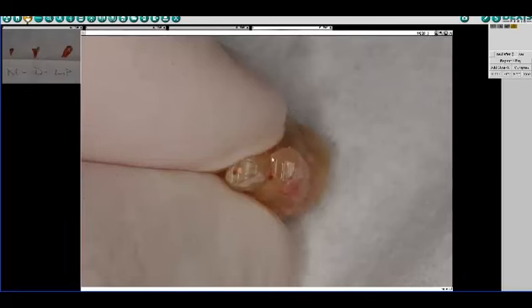It was not instrumented properly and could not be accessed due to significant calcification. And you can see that this particular root, the palatal root, had a canal that was not obturated and instrumented properly. The patient had subsequently been referred for the tooth to be extracted, and that's tooth number 2.